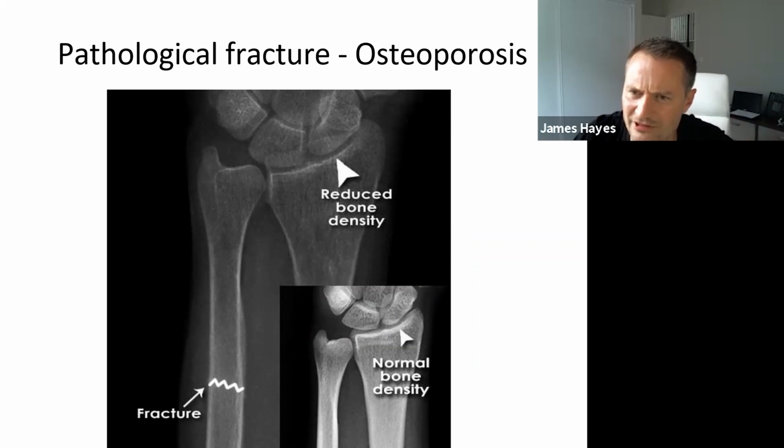So osteoporosis, this is often seen, and it's seen a little bit less now, partly because when I say radiographically seen a little bit less, since the move to digital radiography, there's kind of an Instagram filter on all images that you see. So everyone kind of looks beautiful, all right? But what you actually don't get is down the bottom, that's how white it should be, all right, that bone. That's normal bone density. Now, reduced bone density will show up blacker because remember, there's less stuff there, okay?